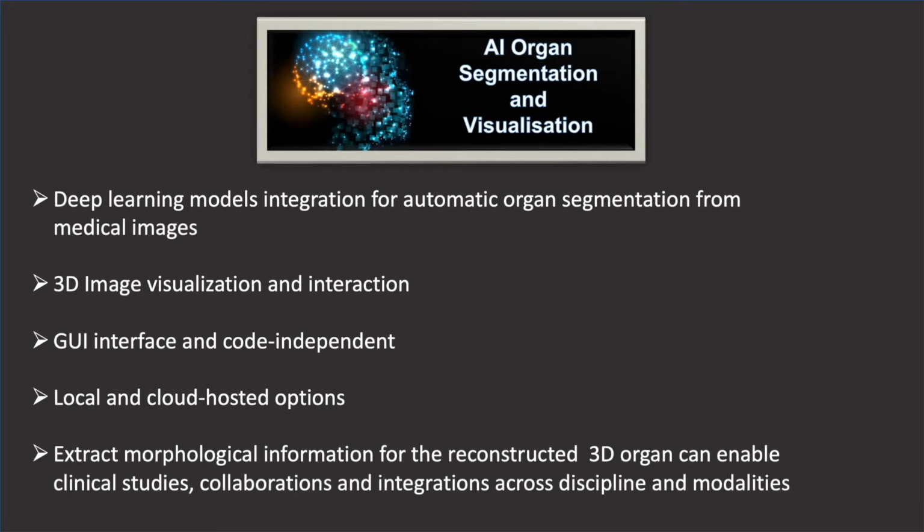Overall, it can be used to extract morphological information for the 3D reconstructed organ and can enable clinical studies, collaborations, and integration across different disciplines. As a demonstration, I will briefly walk you through the application with one of my datasets.